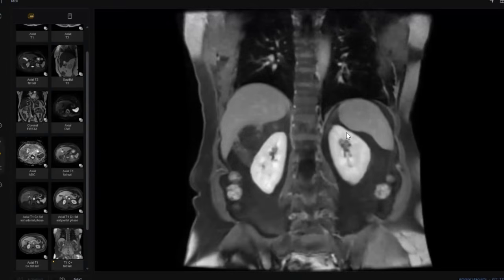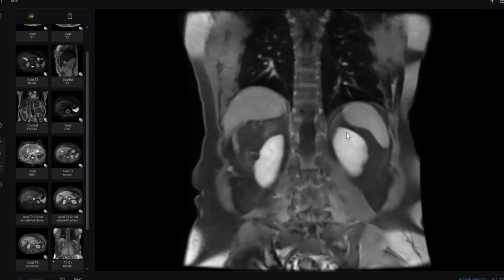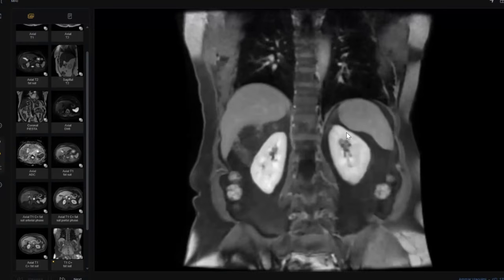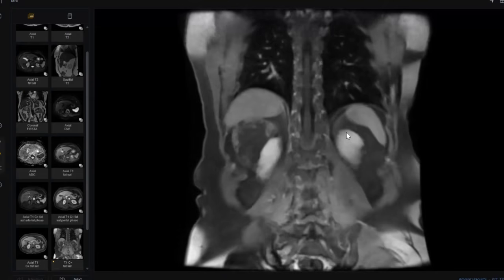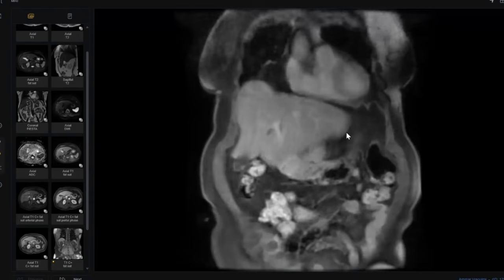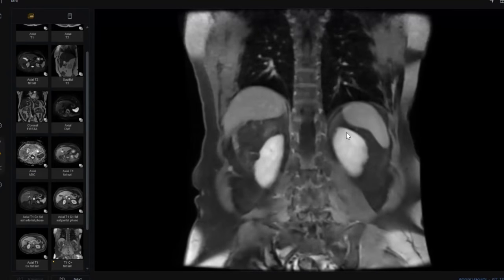To your final diagnosis, you told me it may be AML, angiomyolipoma, or maybe liposarcoma. Give me two proofs for one of them. Okay, sir. I would like to see the rest of the viscera, sir. In the lungs, I don't appreciate any kind of cyst, sir. I would like to correlate with the chest and look for further findings of tuberous sclerosis.